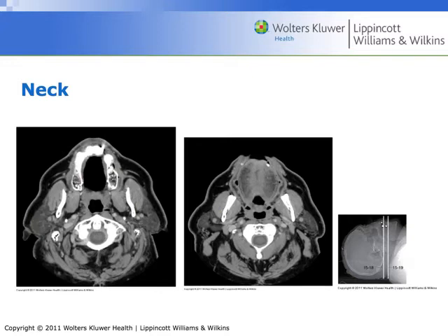An important place for us to look for cancers and infection. Right beside it, right here, that vascular structure there is the retromandibular vein. Retromandibular vein. Bright white right here on either side. The internal carotid artery. Right there.